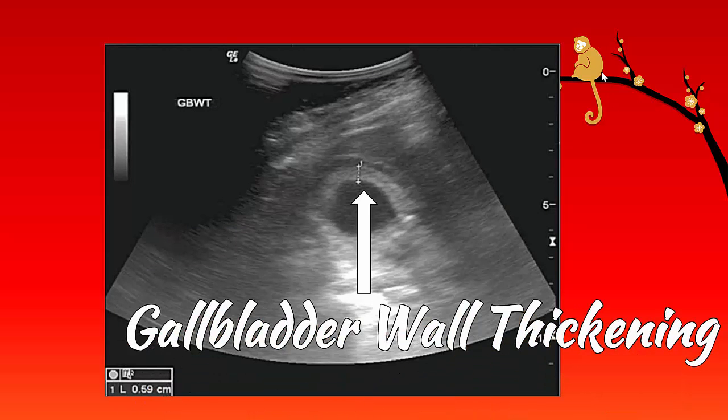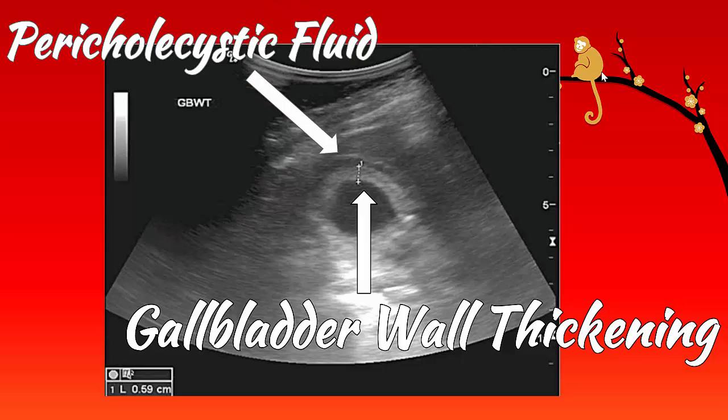Here we have an example of gallbladder wall thickening. You can see there with the calipers, it's measured at almost 0.6 centimeters or 6 millimeters, which is almost twice the normal size. And then additionally, there's some pericholecystic fluid hanging out behind the gallbladder there. So this would all be consistent with cholecystitis. And in these cases, you're of course going to want to get a general surgery consult.